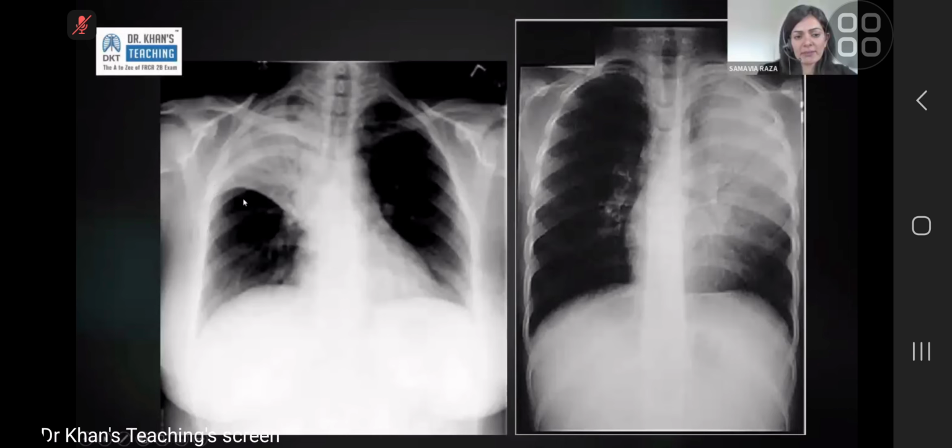But when that fissure is straightened up, or when very rarely it's bulging downwards, it tells you that there is mass effect, or there is actually expansion of that lung tissue. And the only way that can happen is when the air spaces have filled up so much that they're actually bigger than they would be if they were filled with air.